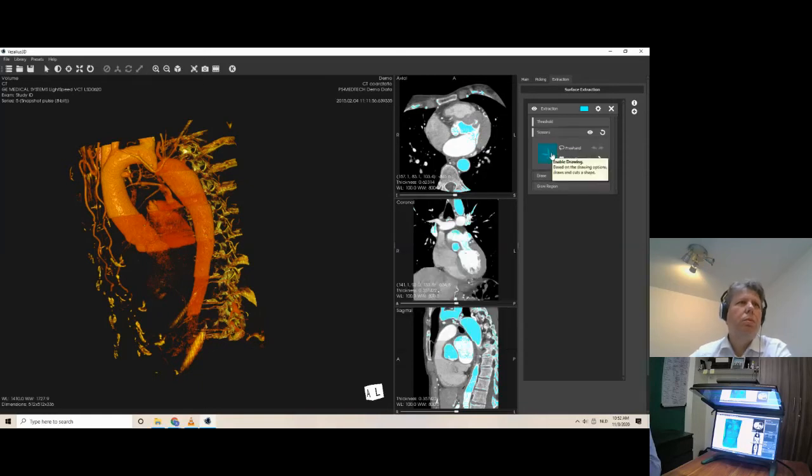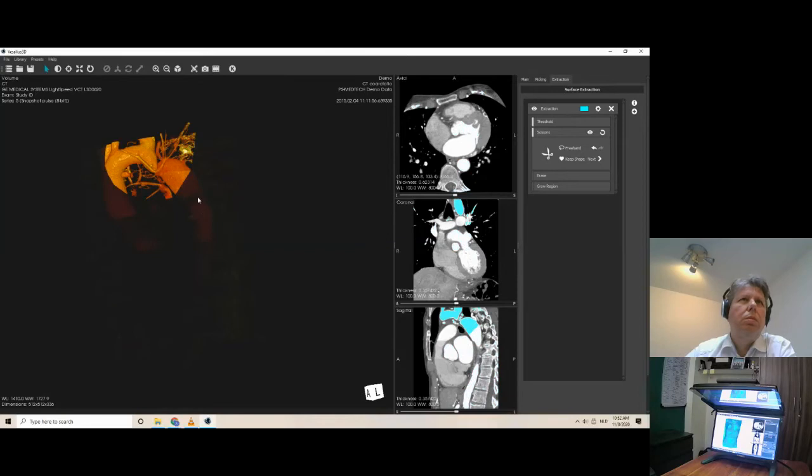This is the best tool we developed in years. Honestly, this is the best tool. This makes people that are not experienced, their lives very, very easy. It's called the scissor tool. Couple of elements: freehand, keep the shape. Keep the shape is a wonderful thing. So I hit the scissor tool. And now, which shape do I want to keep? I want to keep this shape. Machine is working. This is what I want to keep.